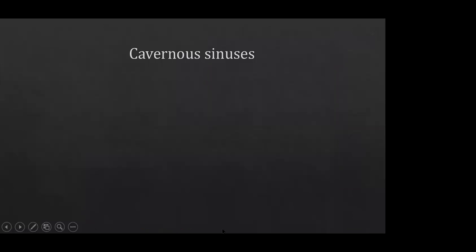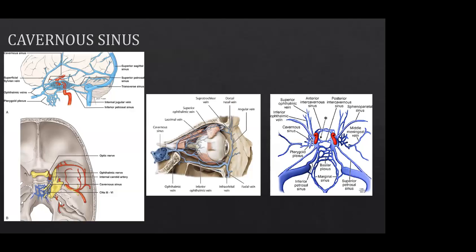Okay, I would like to share some moments on the cavernous sinus because it's quite a vital sinus in terms of its drainage pathways, but also quite vital in terms of understanding the pathophysiology, and also to look at the surgical implications and the medical implications. So let's look at the anatomy of this.